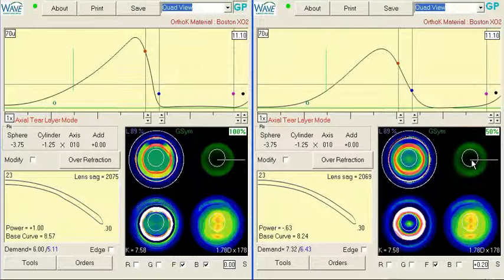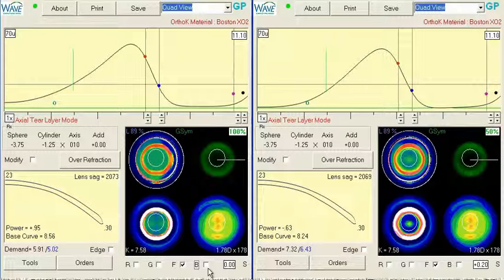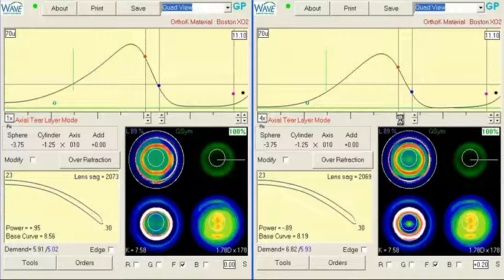All right, so there's about a diopter and a half differential. And then what we need to do is reset our total demand. So we were starting with 6.0 on the side, but this was with the blending turned off. I'm going to turn the blending on so we have more of an apples to apples comparison, and 591. So right now we're at 732 in 100% mode. We're going to reduce this. All right, so we're at 591.